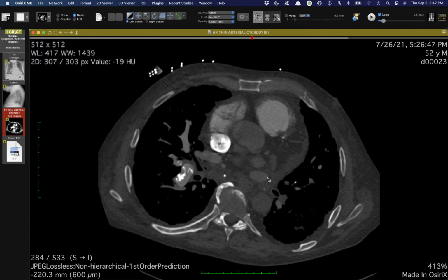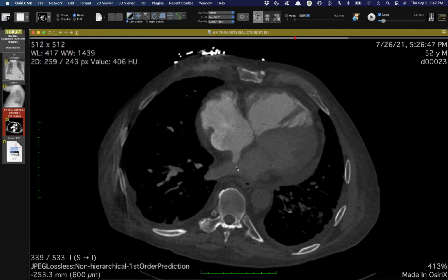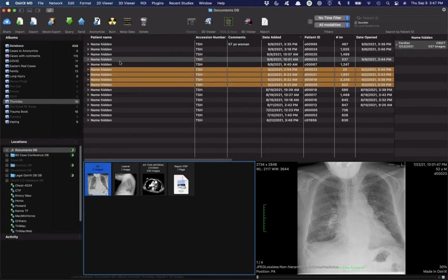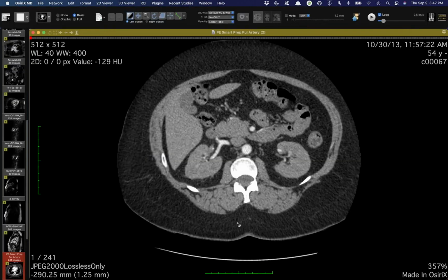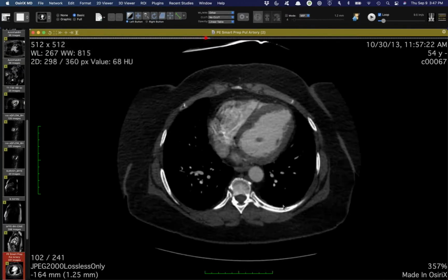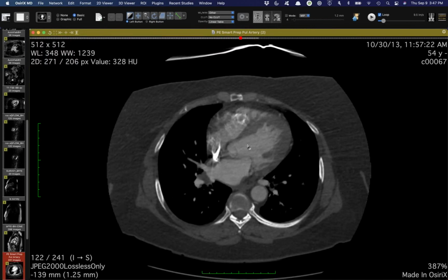If I remember, it's usually a valvular lesion, right? I thought it was usually maybe. I pulled up one other case. This is the other one I had from UCSF, and I think this one was in, I have to remember where it was. Yeah, this was one that was in the RV, just sitting there.